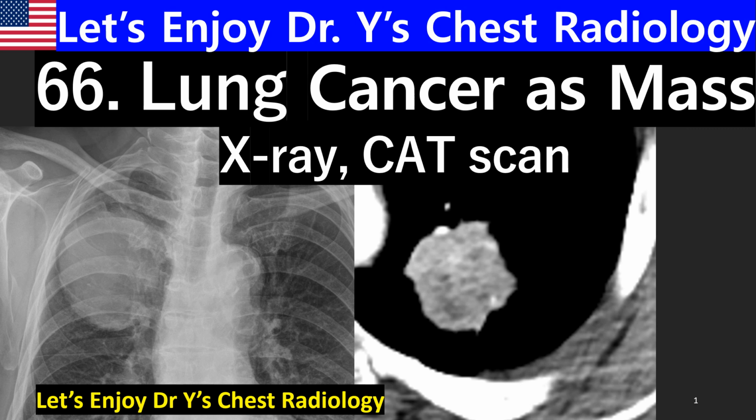Chapter 66. Today we're going to talk about lung cancer as a mass on chest X-ray and CAT scan. Lung cancer manifested as mass on chest radiology. Let's go.